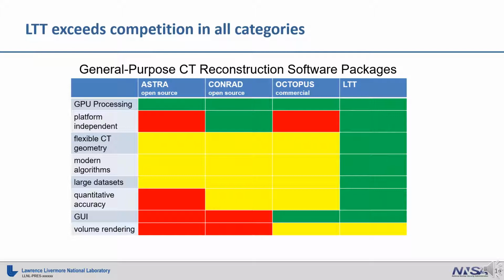But I wanted to make a point here that LTT is for processing and reconstructing CT data. It's not really designed for data visualization. Although we do offer some volume rendering, we keep it at a minimum because that space is filled with a lot of great software that already exists that we would never even want to compete with. Like I said, we do offer a little bit, but that's just because it is nice to see what volume renderings look like as you're processing the data. But if you really want the professional stuff, you just go off to another package.